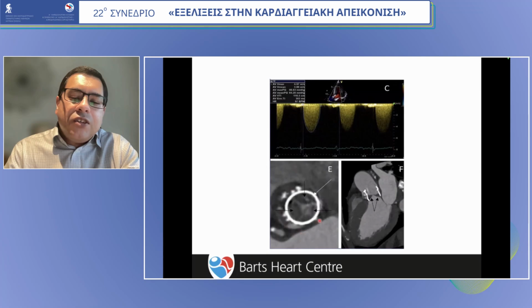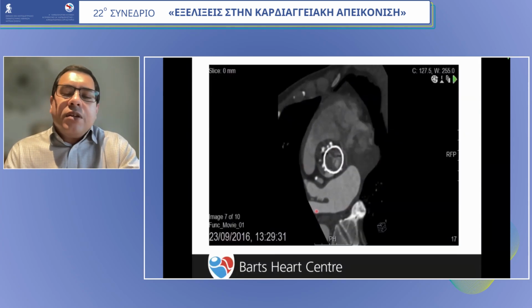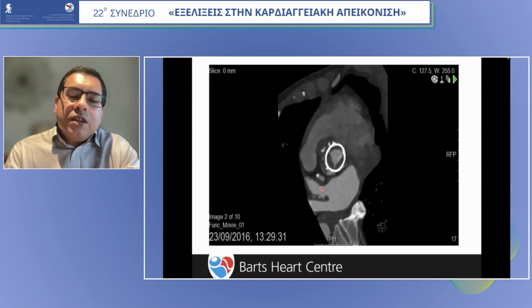And we did a CT, and you can see on the CT, in the same place we saw in our TOE on our case, there's clot in between the valve strut and the valve leaflet. It looks almost identical to the TOE we had on the other valve thrombosis case just a few minutes ago. And we can see the clot on all three leaflets on the CT. And we can play the CT, you can see the clot on the leaflets in the dark, almost black areas.